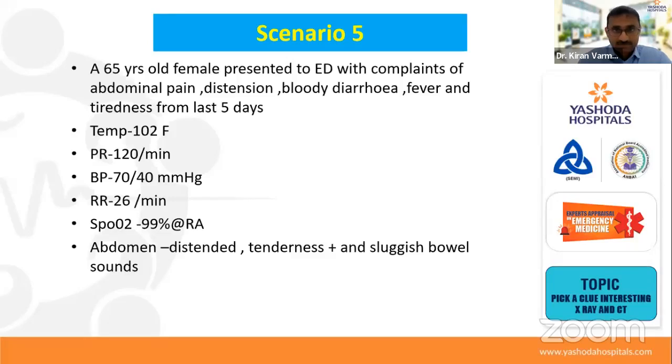Diverticulitis, toxic megacolon, mesenteric ischemia. Good. Yes. So keeping all these differential diagnoses in mind, we have done the X-ray.